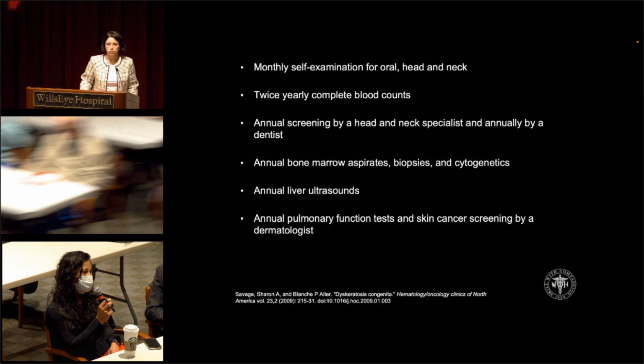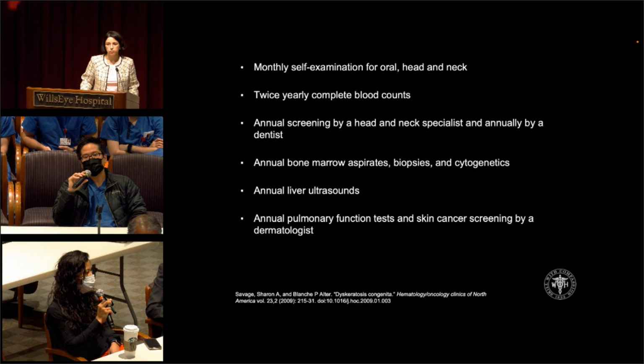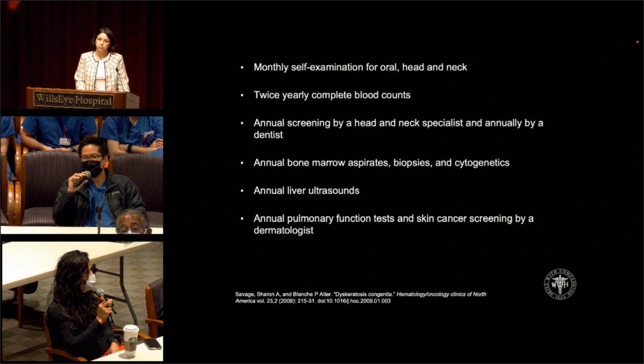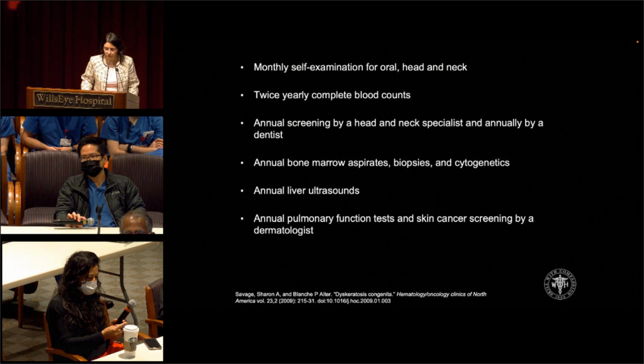I wouldn't do it as confluent or hot like you do for ROP. I wouldn't say hot for ROP, like medium. Probably like how you treat FEVR. The difference with sickle cell is that some of us for sickle cell apply some laser posterior to areas of neovascularization. I don't think that's really necessary here, but again, we don't really know too much yet. Okay, thank you. Moving to the next case.